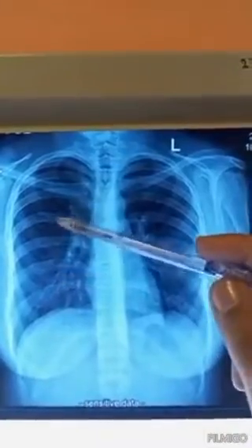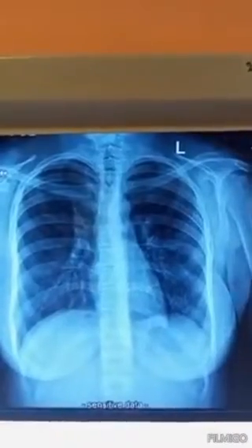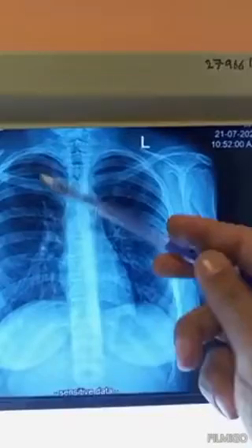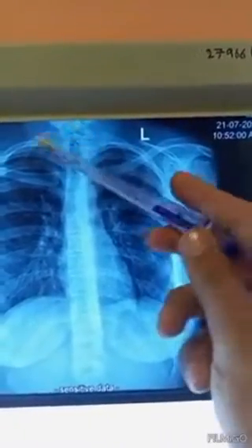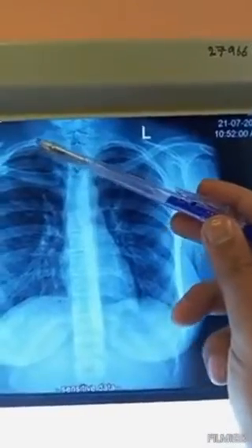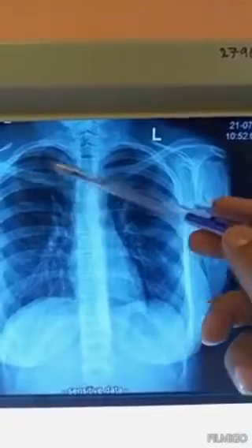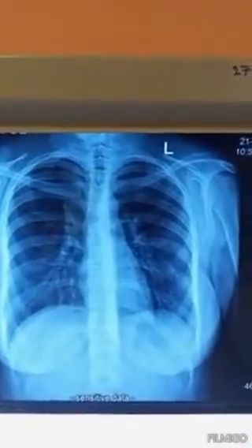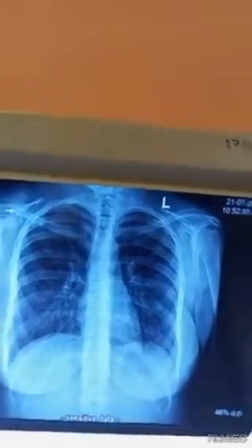If the ribs are less than 5, it means that the x-ray has been taken in the expiration phase. The lung fields will be smaller, the diaphragm will go up, and the neck region and the upper portion of the shoulder will come down. The number of ribs for the lung field will be less than 5 to 6 during expiration, and that x-ray won't be good for diagnostic purposes. So comment on inspiration too, right?